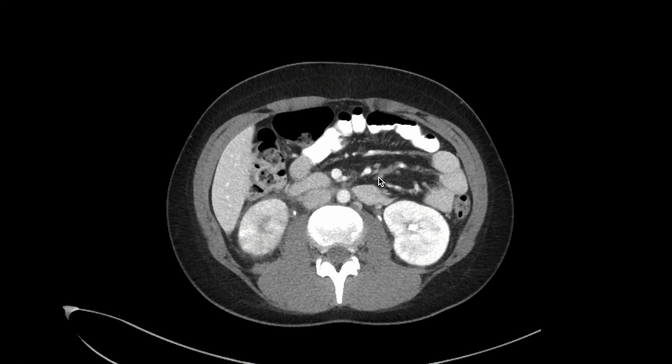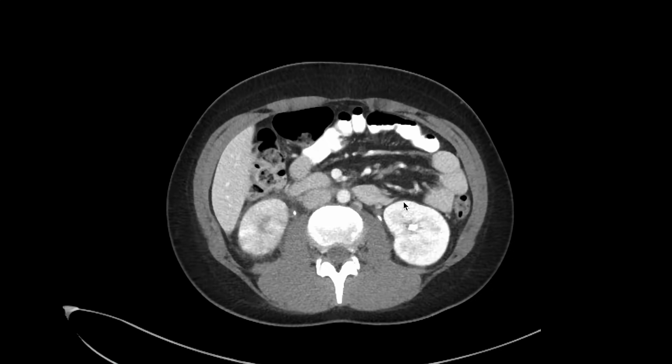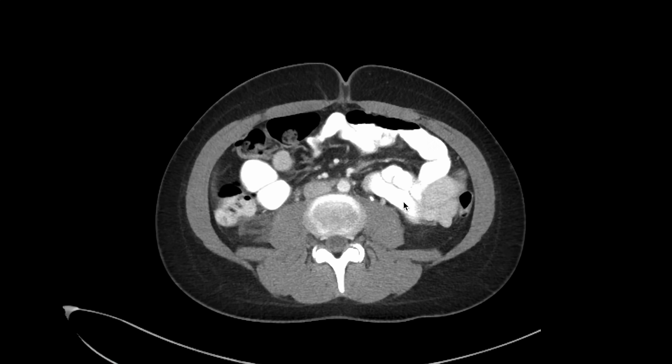If we thought the lymph node was abnormal and measured it, you have to remember that size is not everything. There are different size cutoffs for various stationed lymph nodes, but in general, if you remember around 1 centimeter as a cutoff, you'll probably be pretty safe. But again, size is just one part of the picture.